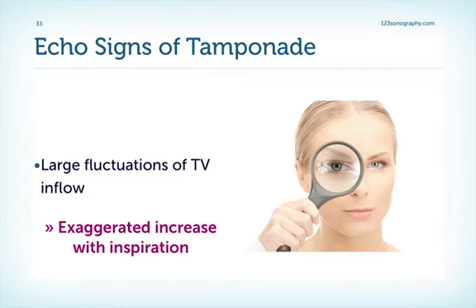However, there are settings where it is difficult or even impossible to use the Doppler tracing. For example, in atrial fibrillation, where you normally have fluctuations of inflow velocity. It is also more difficult if you have a swinging heart motion because the heart moves in and out of the sample volume of the pulsed wave Doppler, which can also lead to fluctuations.